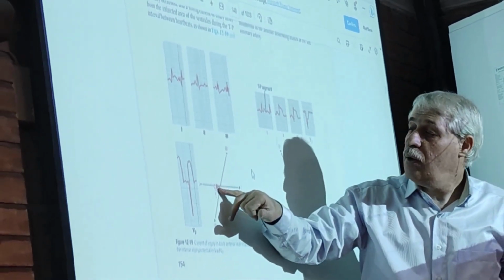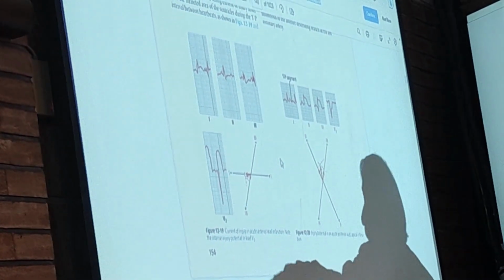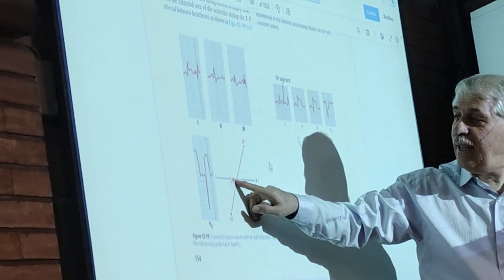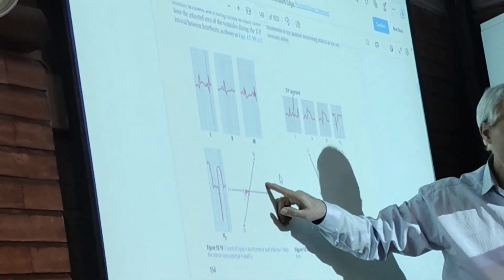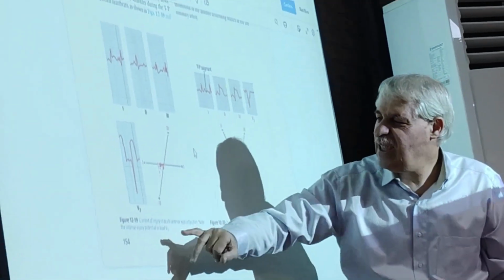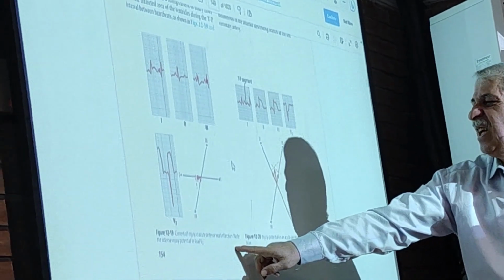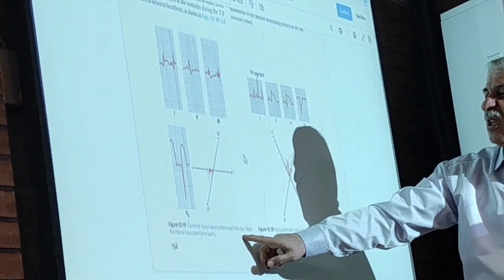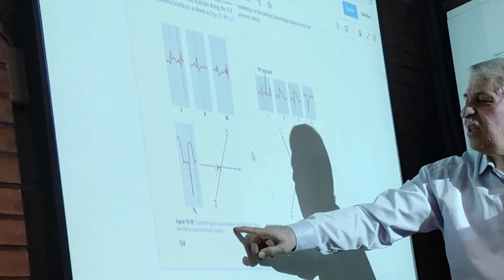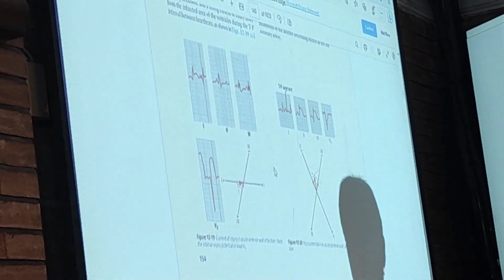It is directed to the positive end. The negative end is somewhere in the anterior wall of the left ventricle. So we have anterior myocardial infarction. Acute anterior myocardial infarction. So, how can I guess it is the anterior wall of the left ventricle?